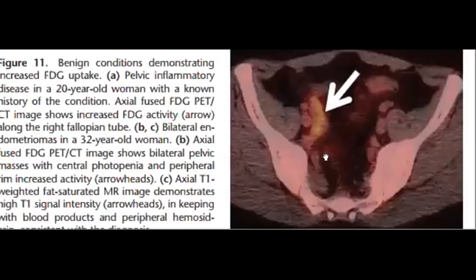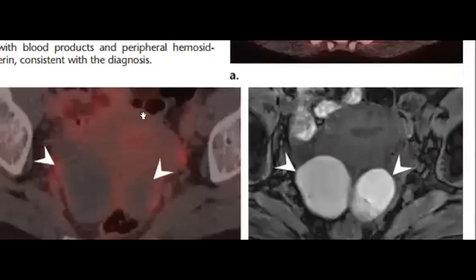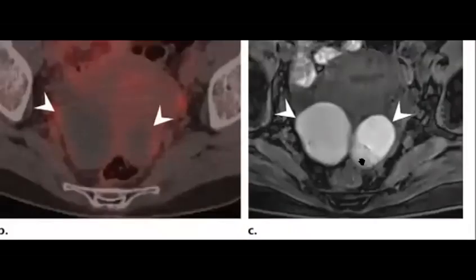Yeah, perfect. So this was, yes, high content hemorrhage, bilateral endometrioma. Sorry, this one, yeah, it will be endometrioma. Okay, perfect, nice discussion. So try to take it step by step, you'll reach your approach. Yes. So no, it's not.